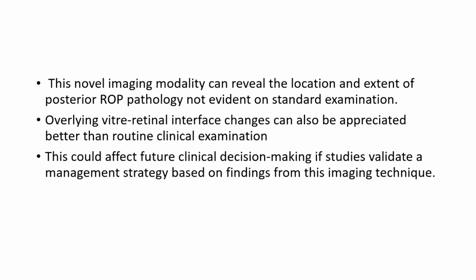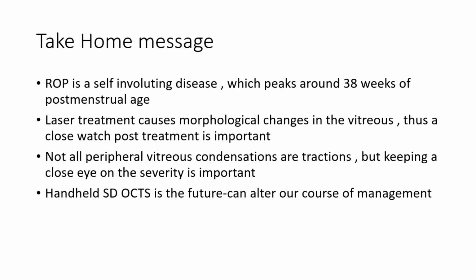So this novel imaging modality can reveal the location and extent of the posterior ROP pathology, which is sometimes not evident on standard examination. Overlying vitreoretinal interface changes can also be appreciated better than on routine clinical examination. This could affect future clinical decision making if studies validating management strategies based on findings from these imaging techniques are available.